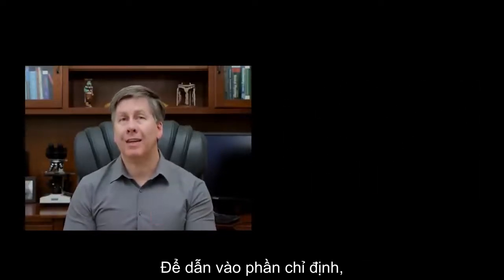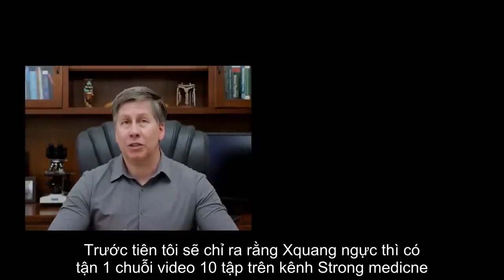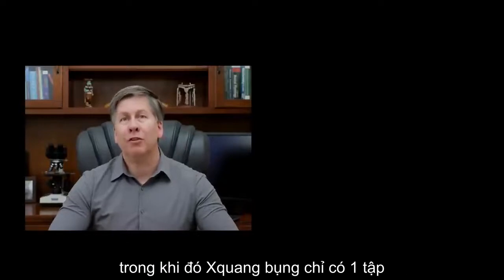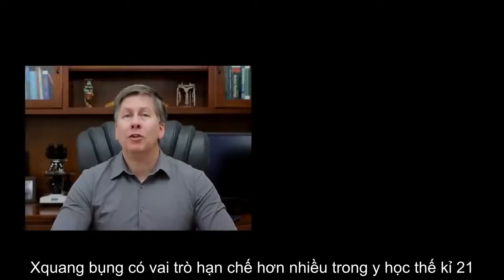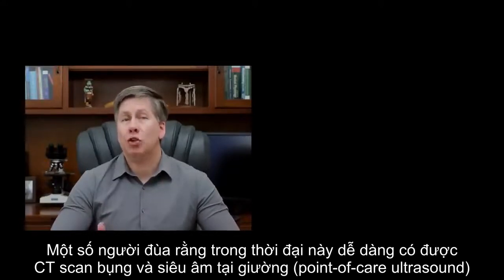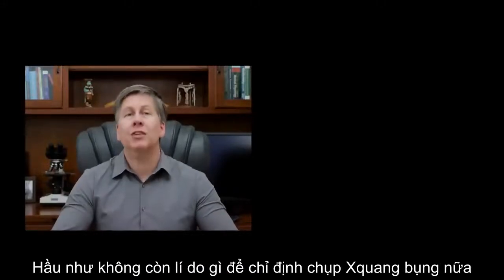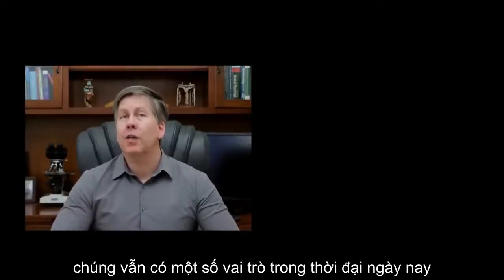As a lead-in to the indications, I'll first point out that chest films get a 10-episode series on strong medicine, while abdominal films only get this one video. The reason for that: abdominal films have a much more limited role in 21st century medicine. Some people joke that in the era of easy-to-obtain abdominal CT and point-of-care ultrasound, there's almost no reason to even order an abdominal film anymore. But while they are much less common than they were a generation ago, they still have some role today.